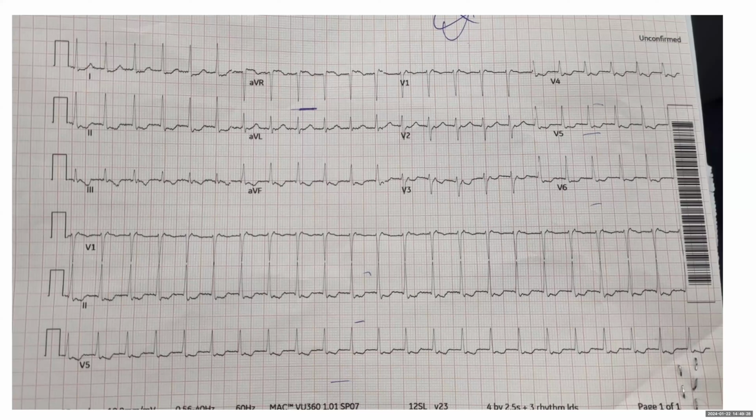All right. Let's do this together. So, you guys coded AVNRT. I think that's fair. Why do you say this is AVNRT? Pseudo R-wave. Yeah, just for everyone, what the standard is talking about is this looks as if it's R wave, but these are P waves. How do you know, why is it pseudo? Why is it not R wave? How do you know it's pseudo R wave? What's the best way to know?